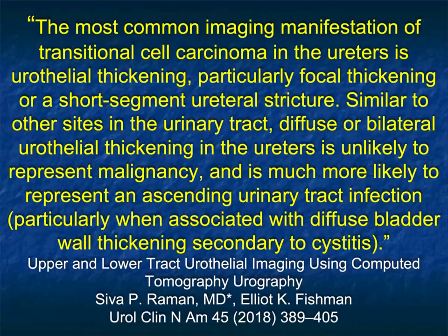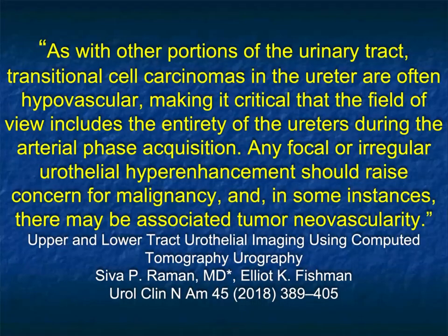TCCs of the ureter can cause hydronephrosis and you see a transition point, but sometimes they simply don't. And often you don't have the entire ureter opacified, so you can miss things. It's very tricky. Now, it can be associated with bladder cancer, but that's not always the case either. So it's very, very important to look at the ureters as carefully as you can.